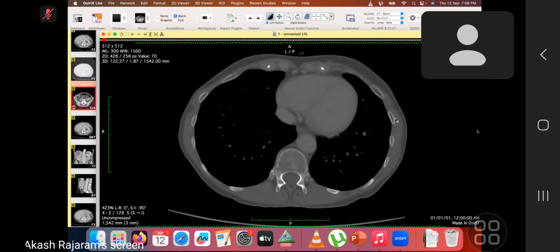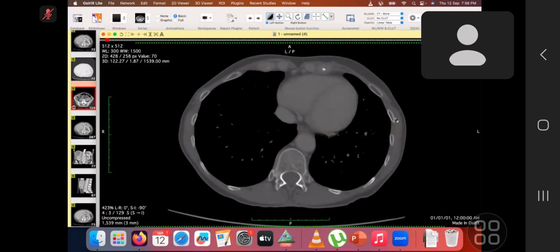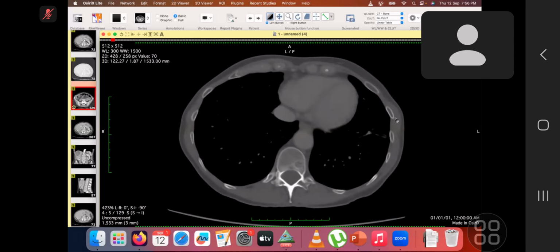Can I see? Yeah. So this lesion has lytic lesion with some sclerotic margins. So this is again suspicious. I would correlate with the sagittal images, but even in this appearance, I am suspecting this to be a metastatic, and in the breast, if there is already any history of surgery or any previous malignancy, so this confirms my findings. So I would communicate my findings to the primary team, and correlate with the previous imaging if available.